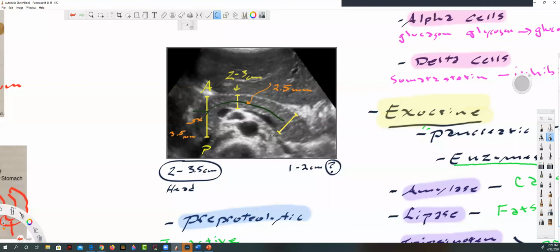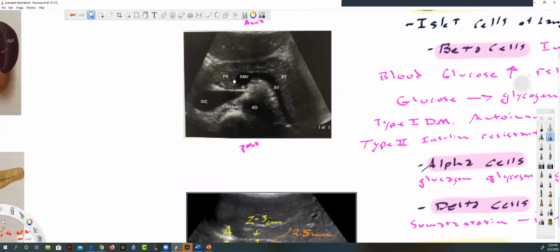One of the reasons why this is either a thin young person or even a pediatric patient, the reason I say that is, look at the echogenicity of the liver and the pancreas. On this person, they're identical. Children and thin young adults have hypoechoic parenchyma, hypoechoic organs. You start getting either a little heavy or a little bit older, and we start getting fat deposits inside of our pancreas. So it is completely normal, and that's another hypoechoic pancreas right there.